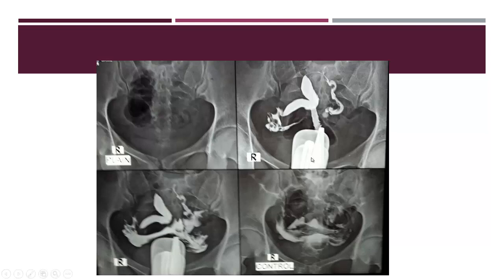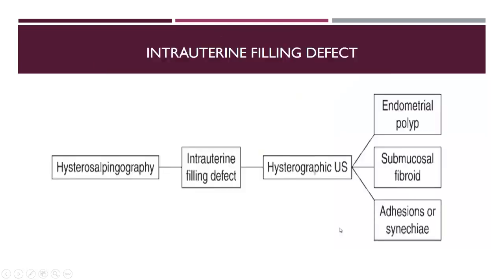Another case, duplicated uterine cavity, and these are the normal fallopian tubes. So this is a subseptate uterus, but better to say duplicated cavity for ultrasound. Then we came to the end of the contour irregularity, we just missed the adenomyosis. We will see a slide for adenomyosis later on.